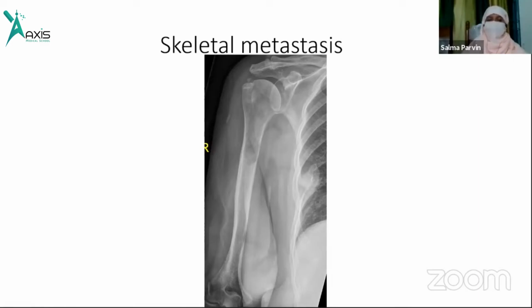So this is the whole thing of a mass you need to study to declare whether this is a mass, and the mass to be benign or malignant, and whenever it is malignant, how desperate it is to be spread hematogenously.